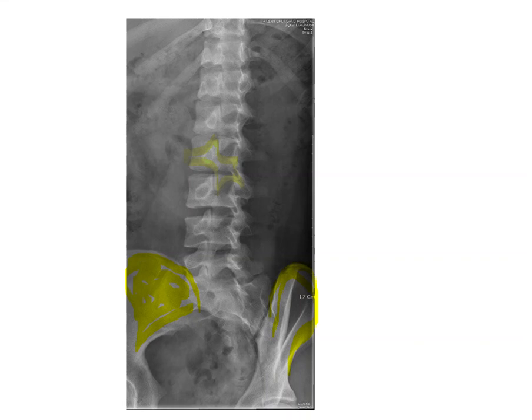This area here is the pedicle. That little round opaque circle is the pedicle, the right pedicle on each vertebral body here. The right pedicle that I'm shading in right now. All right, that's the right pedicle. That's the eye of our Scottie dog.